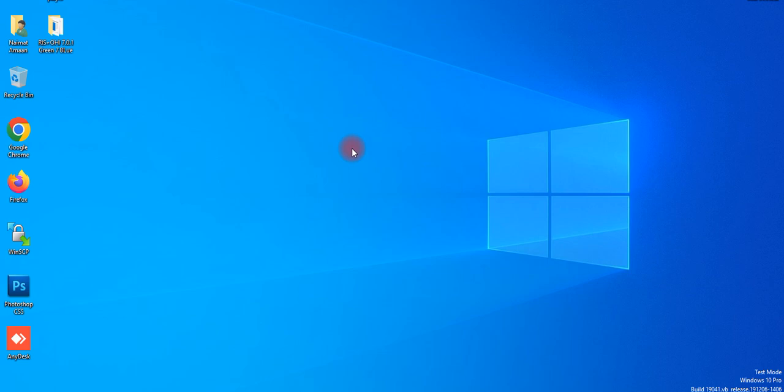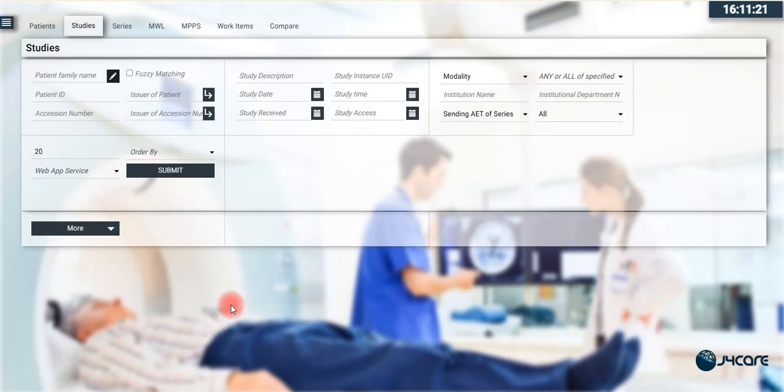In this video I have made a simple solution for how to integrate HL7 with the PACS and modality, and everything. So first of all I will show you the dcm4chee PACS latest version, which is already built in with the HL7 application. This is my dcm4chee PACS.